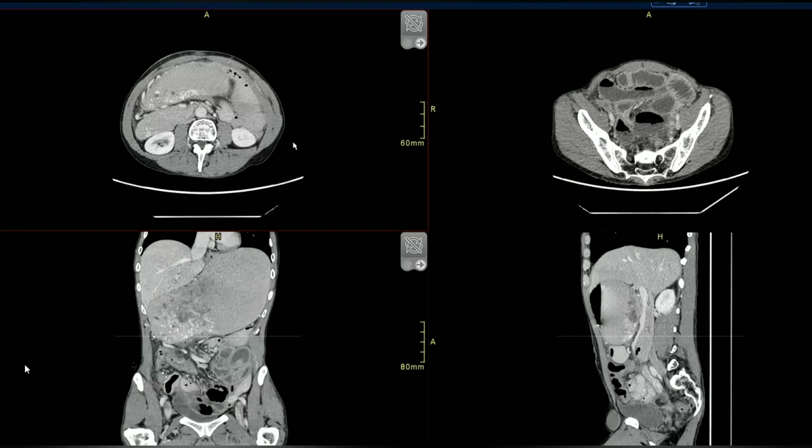The patient is in the emergency. The surgeon is going to come after. What do you want to do before that? Ma'am, I'll pass an NG tube. That is very appropriate. You must say that NG decompression should strongly be considered given the massively dilated stomach. And so there's one important diagnosis you might consider.